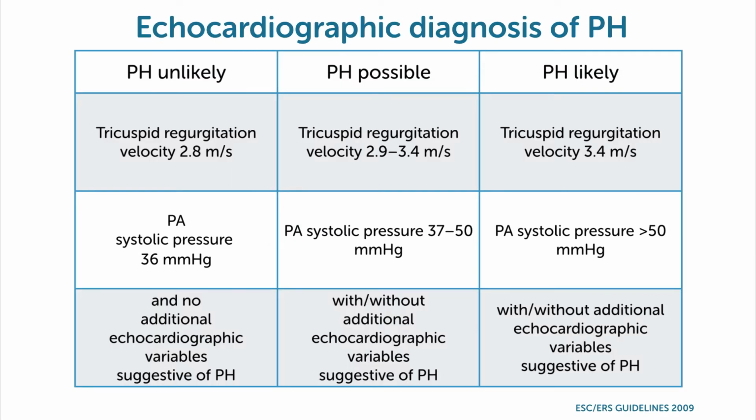And would you worry with this value? Well, actually, when you assess velocity and transvalvular gradient, as the guideline says on pulmonary hypertension diagnosis and treatment, you can suspect pulmonary hypertension. So our patient, for instance, had a velocity which was 3 meters per second with a gradient which was 46 millimeters of mercury. So for him, the likelihood of pulmonary hypertension is there. We could define him a possible candidate to have pulmonary hypertension.